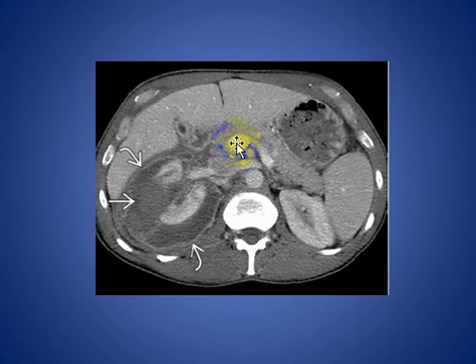Here is a patient with renal trauma, contrast enhanced CT scan performed 10 days post-trauma, with residual clot in the deep interpolar laceration and subacute perinephric hemorrhage. And this completely resolved after 6 months and left only scar tissue.